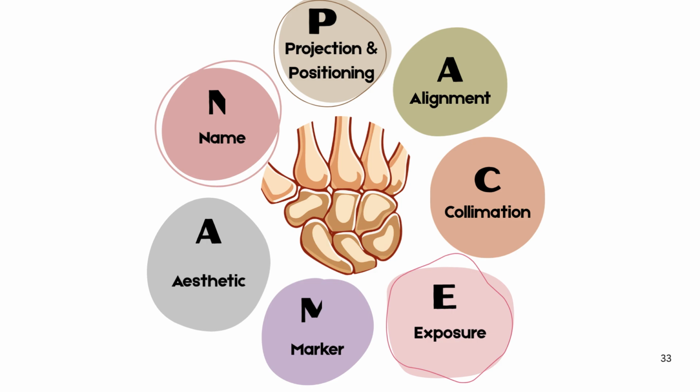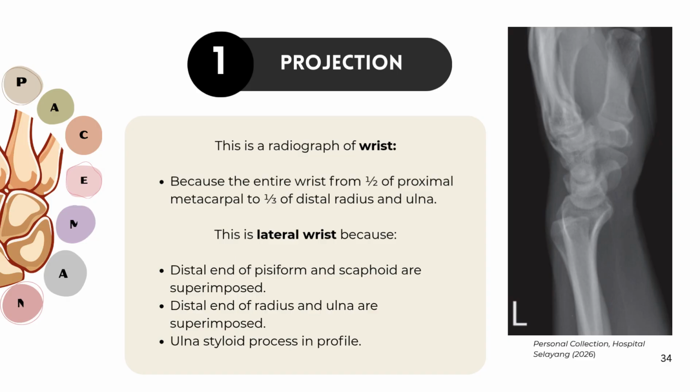For image evaluation, I will use the PACEMAN criteria. PACEMAN stands for projection and positioning, alignment, collimation, exposure, marker, aesthetic, and name. These criteria help ensure that the radiograph is of diagnostic quality and suitable for interpretation. First, we evaluate the projection.